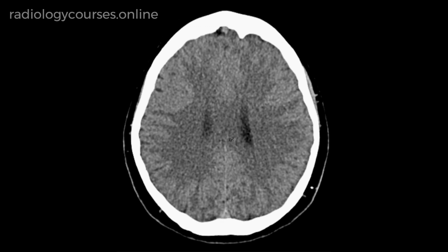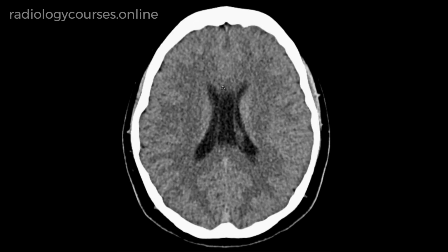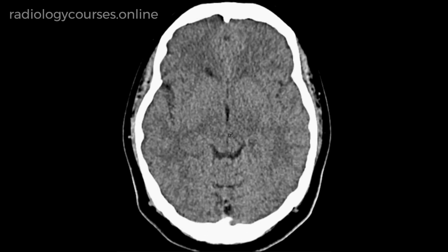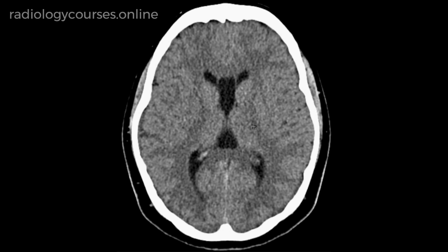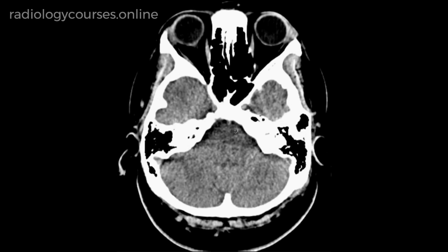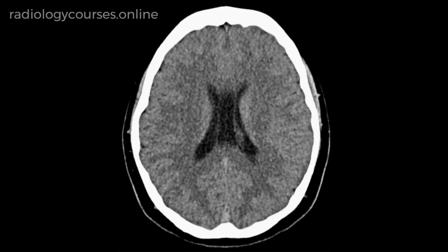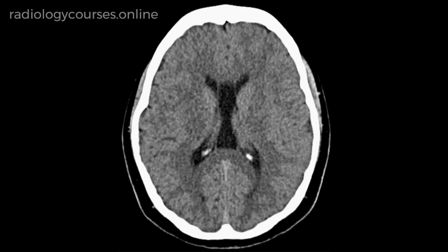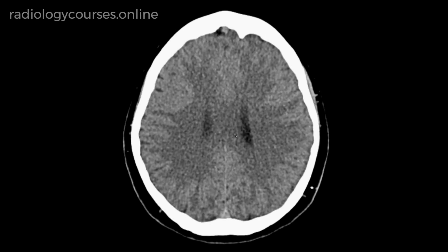rectangular-shaped homogeneous low attenuation area in the midline between the two lateral ventricles, similar to the attenuation of the CSF, limited to the supratentorial region. The lateral ventricles appear unremarkable, the third ventricle appears normal, and the fourth ventricle is not dilated. So this is how I would describe the radiological abnormality, but it is very clear that this radiological abnormality is likely to represent a normal variation.